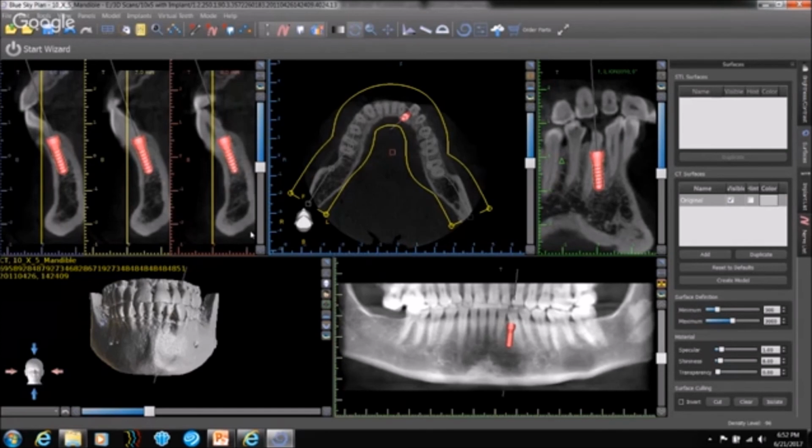One other mistake that I end up seeing, and I wouldn't say it's common, is making a measurement and then finding out the measurement does not correlate. This is not the case when we consistently use only cross-sectional views, which is what I always recommend when it comes to implant imaging.